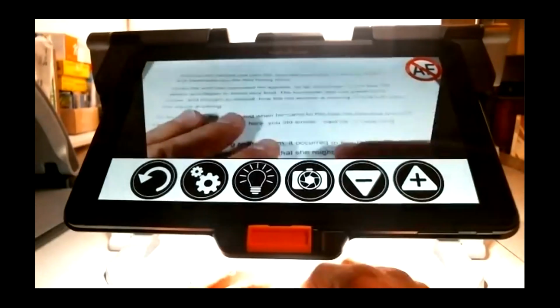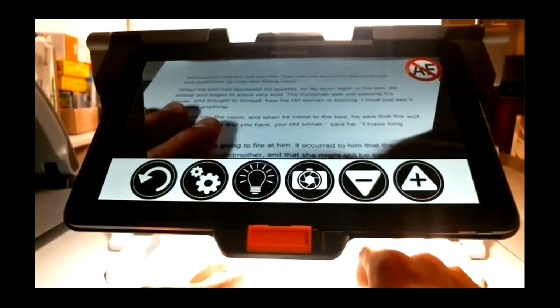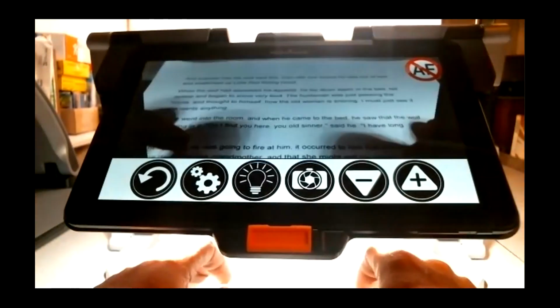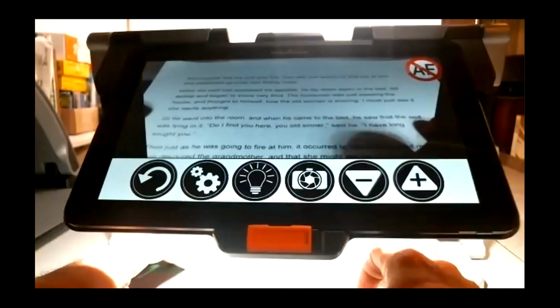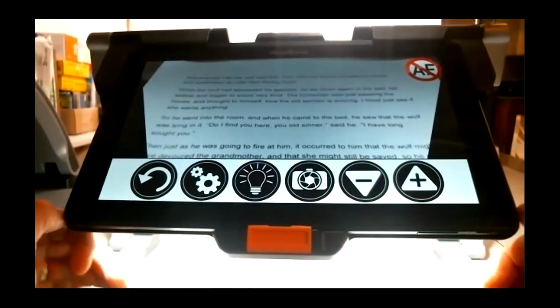This is a nice gesture to turn off the autofocus so you can do your manual task underneath, like writing, maybe just following what's being said on the board, or any kind of task, maybe tying a knot or threading a needle. That's very useful, a very quick way of turning off the autofocus.